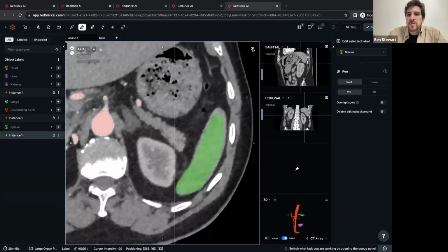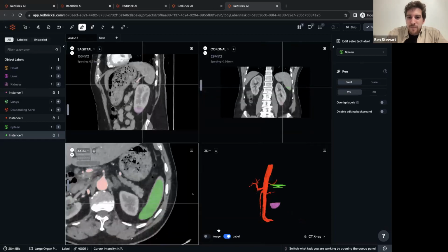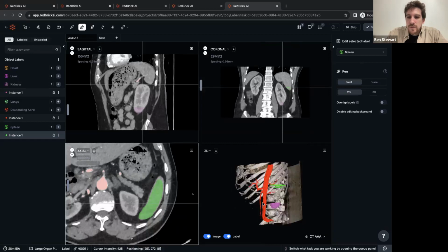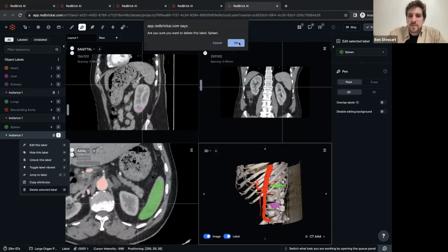Zoom has many submenus that are not terribly well thought out. All right. Okay. I'm going to choose AAA for this. Oh, goodness. That's not what I wanted to do. There we are. There we go. That's my fault for misclicking. Again, with the misclicking, I'm telling you.